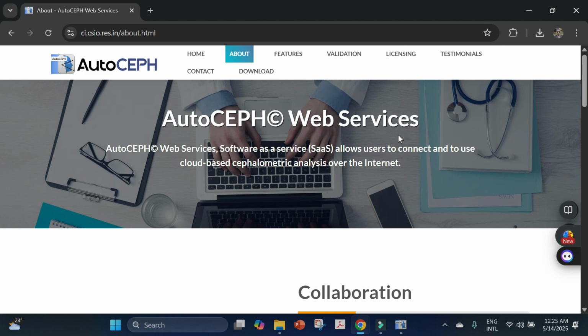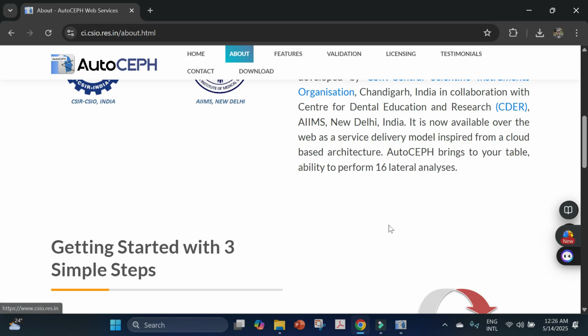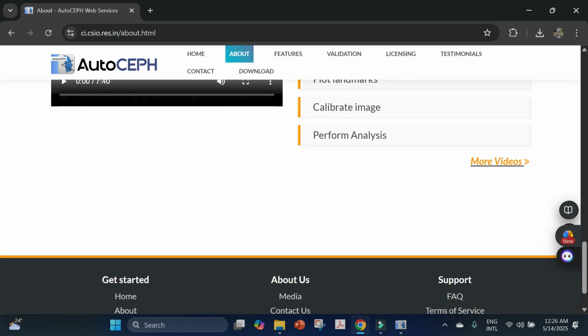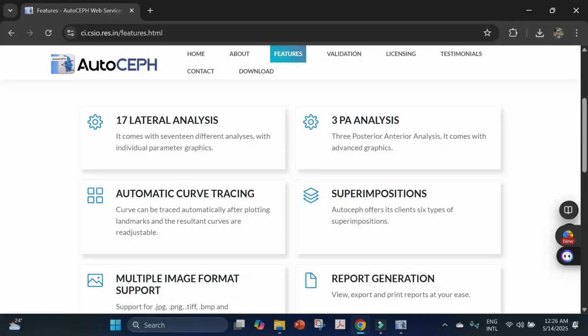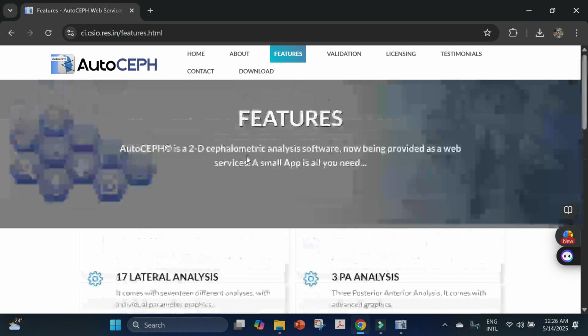Hello everyone, in today's video we'll see how AutoCeph, a 2D cephalometric analysis software, assists orthodontic and maxillofacial surgeons to perform analysis. We can do various cephalometric analyses with this software. Let's see the features. 17 lateral analyses can be done, 3 posterior anterior analyses, automatic curve tracing, and many more.